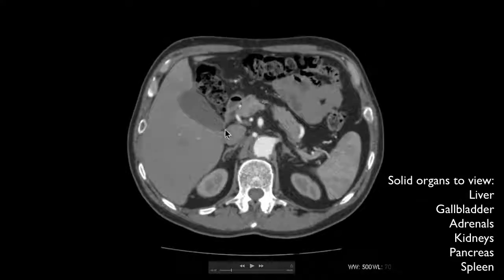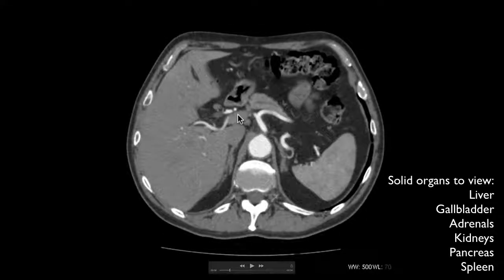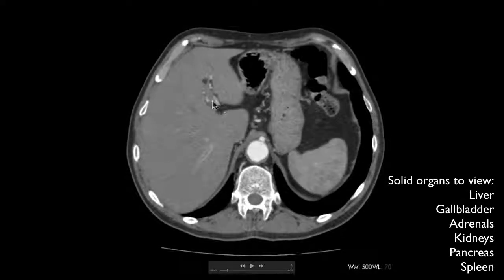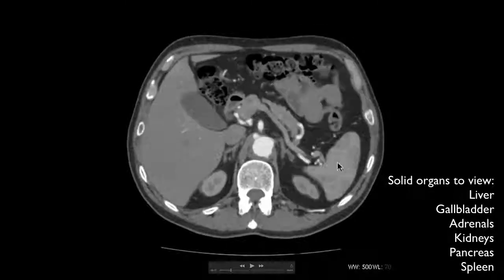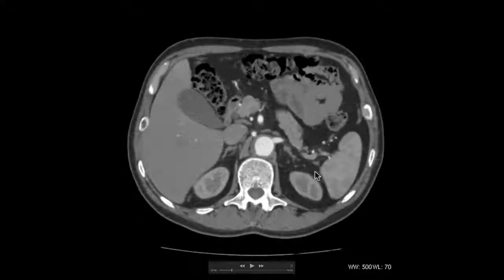Yeah, exactly. So for a standard CT abdomen, you would do it in what's called portal venous phase imaging. That's about 70 seconds after injecting the contrast, and this is the portal vein here. On portal venous phase imaging, that'll be full of contrast, and it also makes liver lesions more conspicuous. On the arterial phase imaging of the spleen, you can see it looks a bit blobby and heterogeneous, and that's a normal looking spleen on arterial phase imaging.